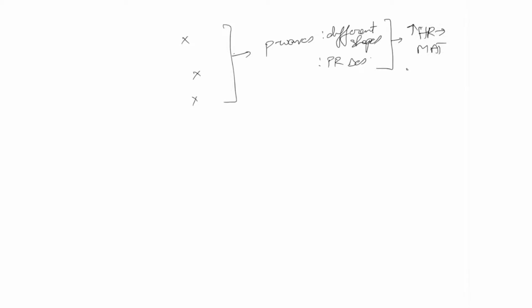And if the heart rate were normal, you would call it wandering atrial pacemaker. So again, in both these conditions, the impulses don't come from the SA node, but they're coming from several different foci within the heart. And so you end up with P waves that are all of different shapes, and the PR interval also changes based on how close it is to the AV node. And so you end up with this specific rhythm.